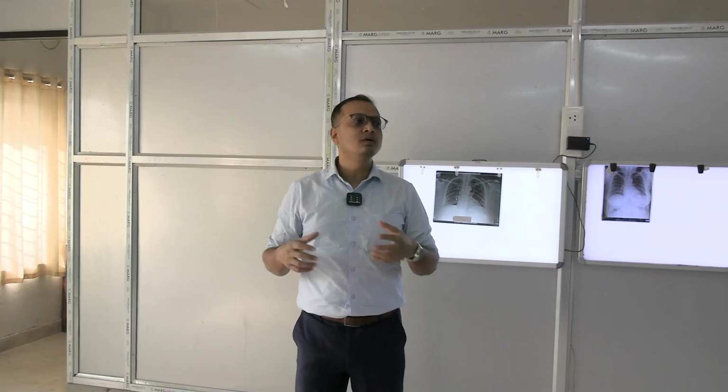We have a space on the right side and the left side, which we call the pleural space, which holds the pleural cavity with the lung. So we are going to see lung shadows present on the right side and the left side, and in between the right and left lung shadows we have an in-between space. We call this in-between space the mediastinal space. Ninety percent of the mediastinal space is occupied by the heart and the structures getting in or coming out of the heart. So the heart with the vascular structures occupies the principal mediastinal space. That is what we are going to see. So whenever we address the soft tissue shadows here, we have to delineate the lung shadows.